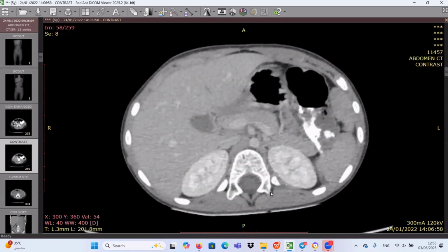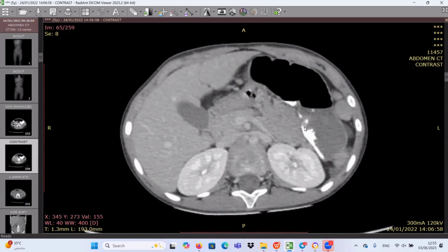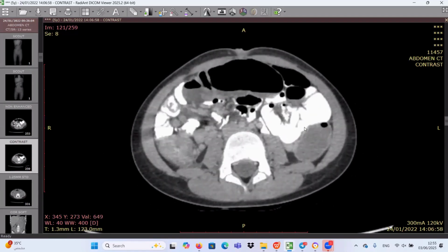So we have the abnormality localized at the right side of the colon, mainly the ascending colon and cecum, going to the adjacent part of the transverse colon. But I think the left colon is totally free. Is it logical to think of ulcerative colitis?